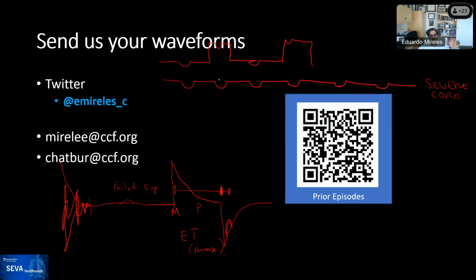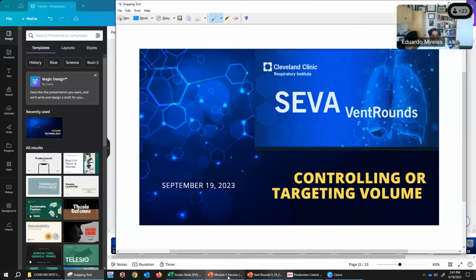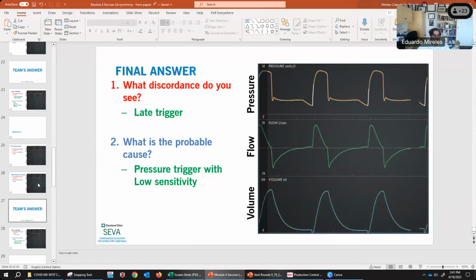In this case, I think what's happening is there are false triggers, but they're occurring throughout, and it depends which one you grab how you're going to call it. This is one of the major issues with any classification: what would you call this in reality? If you're seeing all of these going through, this is mainly an issue of failed trigger rather than a reverse trigger. I do actually have an example that I can show you really fast that may be useful for you to recognize that. So let me show you this example.